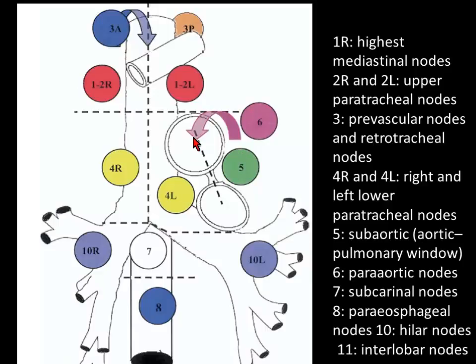So this is the aorta, and probably you have got the pulmonary artery. So it's AP window lymph node. Yeah? You can say it's AP window lymph node, or what I said commonly, this is the trachea, this is the bronchus, so it's the tracheobronchial on the left-hand side. That reflects exactly the same as AP window lymph node. Yeah?